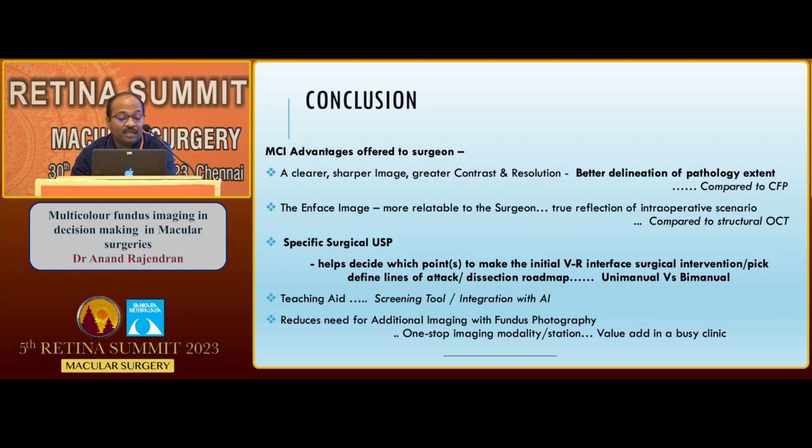Because of the sharp images, it lends itself very well to futuristic AI-based screening models. And importantly, it reduces the need for additional imaging with fundus photography, part of a one-stop imaging modality or station, and that is a serious value add in a busy clinic today.